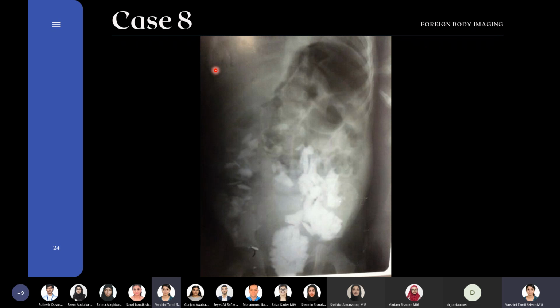Abdomen, absolutely correct. What in the abdomen is being affected here? Where is the foreign body in this abdomen? Okay, what organs does the abdomen have? I need to go very simple with my questions.